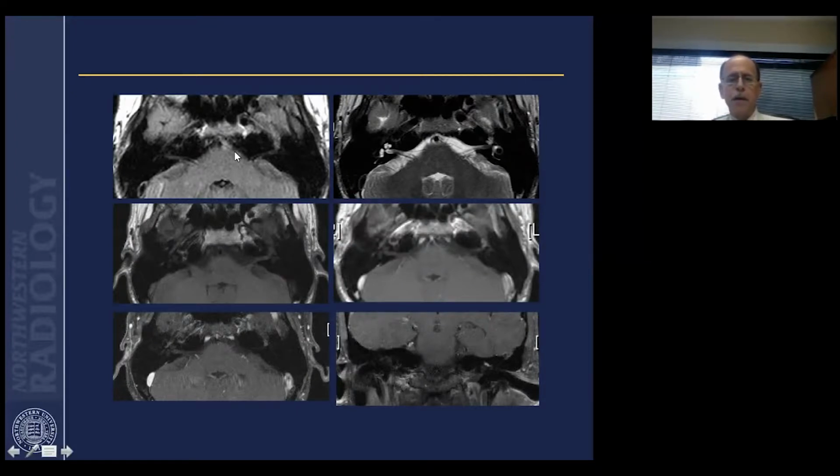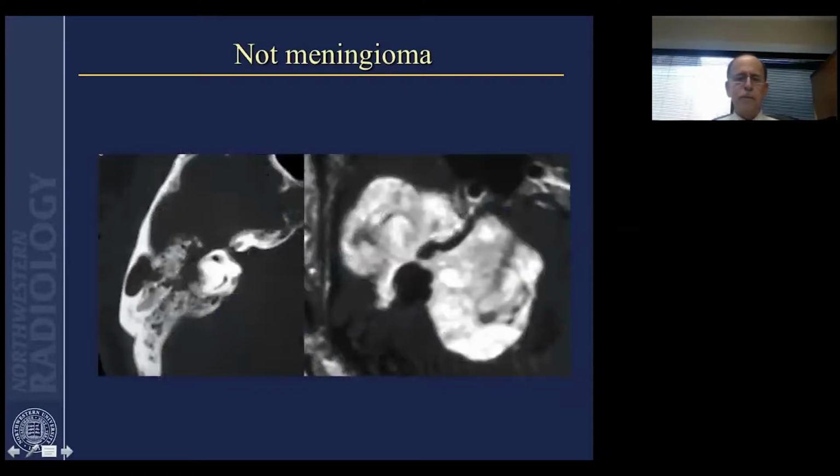This is a case of a patient with a left facial nerve palsy who does not have a tumor. Notice that you can see enhancement on the contrast enhanced study in the geniculate area. That's asymmetric. Enhancement is not always pathologic in this region, but if it's asymmetric and the patient has a facial palsy on the appropriate side of the asymmetry, you're justified in suggesting that it correlates with a Bell's palsy.